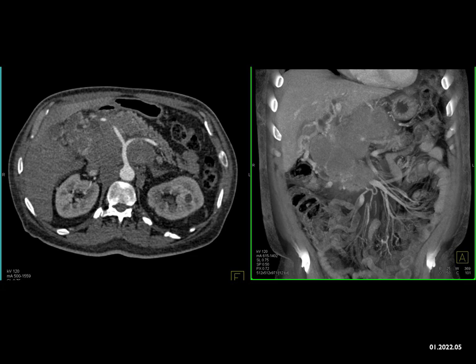And I showed this case at conference at Hopkins, and people said lymphoma. And I agreed. I said I typically would say lymphoma. Looks like lots of nodes, lots of mass. Now, it's true lymphoma compresses rather than obstructs vessels, so it's a bit uncommon for lymphoma to give you a cavernous transformation of the portal vein, but I guess it could. But after biopsy, this ended up being metastatic lung cancer to the pancreas.